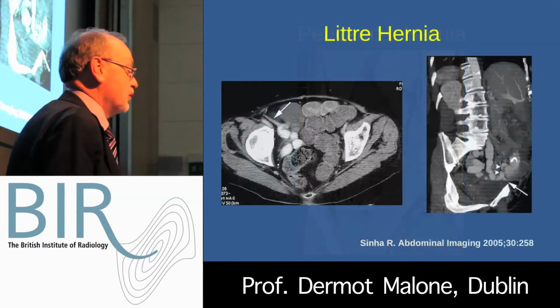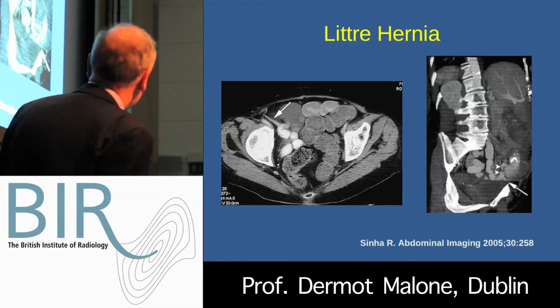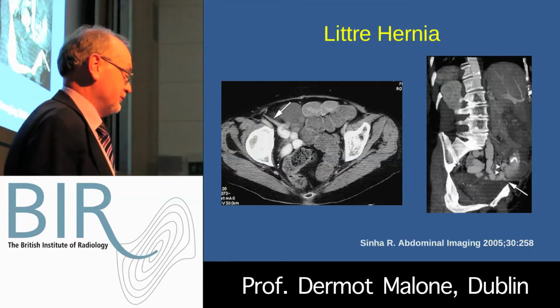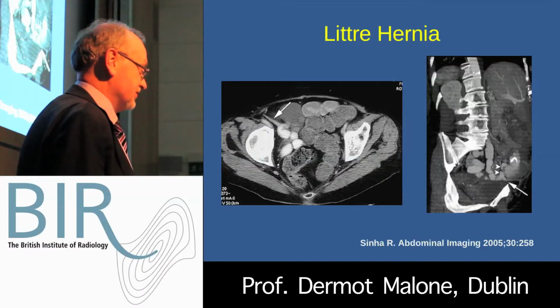Or a hernia where a Meckel's diverticulum herniates into the femoral canal and causes small bowel obstruction. So it's one of these, look carefully, you may see this only once. If you ever see it and get it right, your surgical colleagues will be most impressed.